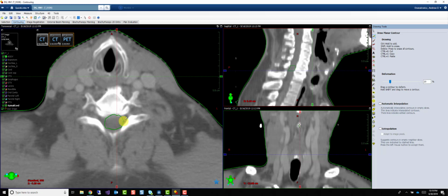The other nice feature is you can see when it highlights like that. I can click right on the line and then manipulate the contour that way. If I right click and hold it down and drag left to right, you can see that white line gets bigger or smaller. So I can change the length of that deformation. So if I want to move a big section of my contour, I can move it to the right. Now if I click, it is changing that whole white line, or that bigger portion. If I drag it more to the left and make it very small, it's only moving that small portion. So you have a lot of flexibility all with this one tool.